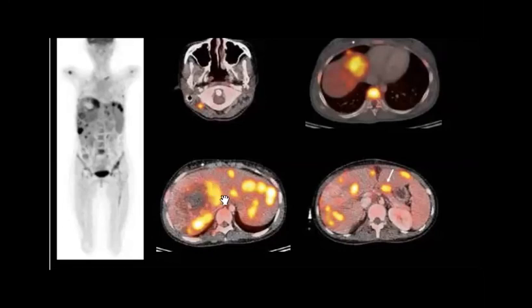You will find that this patient has something in the circulation with high cardiac output, like cardiomegaly with shunt and so on. So you cannot put it, because you already have metastasis everywhere. Okay.